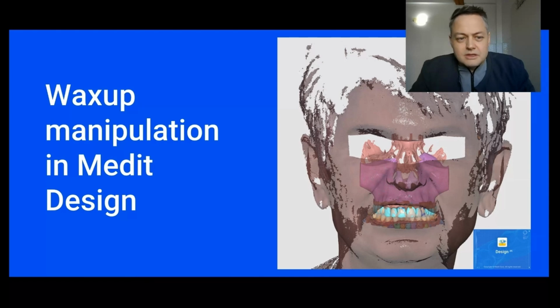And with that said, I want to point out that Medit Design for me has become an invaluable tool. Initially, I was going out of the design software and going into Mesh Mixer. That was the software I used for a long time. It still is in some very unique situations, but most of the time, everything I do comes down to Medit Design. And here you are going to find almost all the tools you need to get a predictable and extraordinary result. So great tool from Medit. Please use it and please follow the next steps.